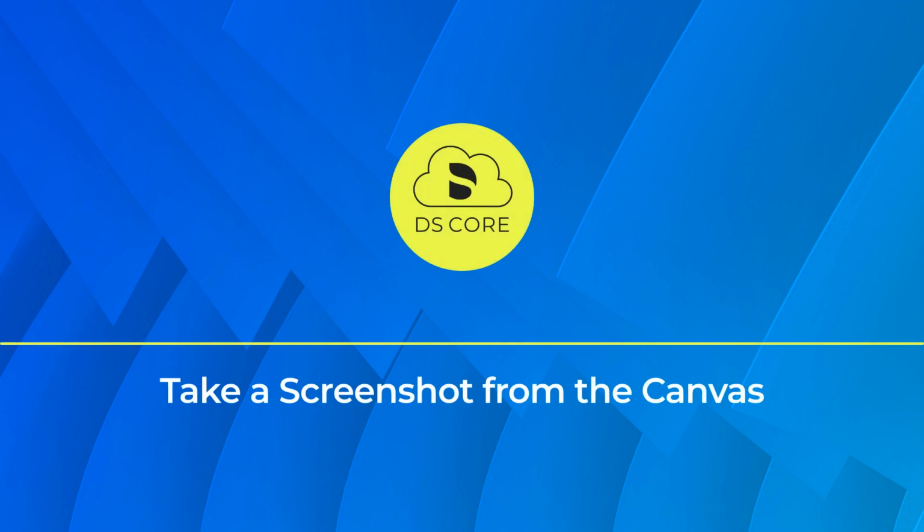In this tutorial, you learn how to capture and save a screenshot directly from the canvas. This feature allows you to create a static image of the exact layout, annotations, and slice positions you see on screen, making it easier to document and share.